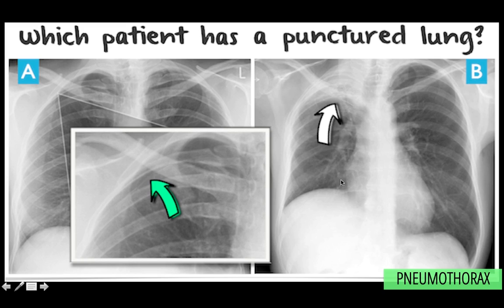This in turn has led to a clear reduction in the lung volume, as well as elevation of the diaphragm on that side. So this was caused by radiation-induced fibrosis. Usually with a PA or an erect patient position, air will always be sitting superior or at the apex of the lungs. As a result, you shouldn't see the increase or the lifting of the hemidiaphragm on that side.